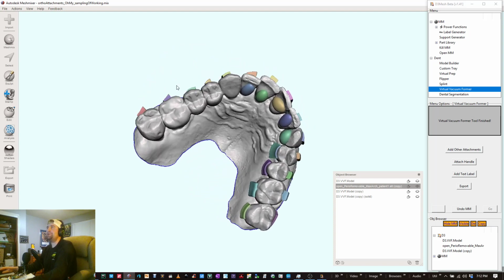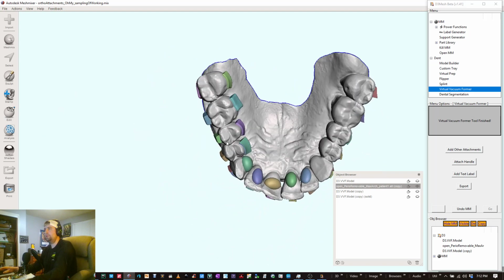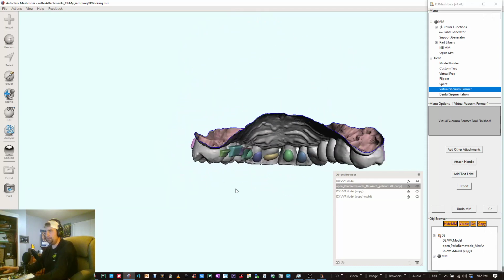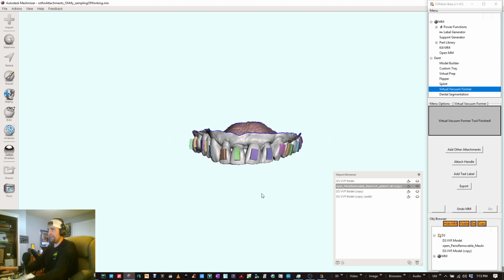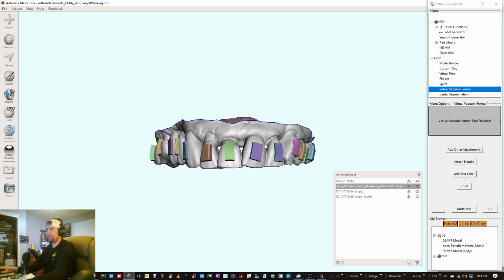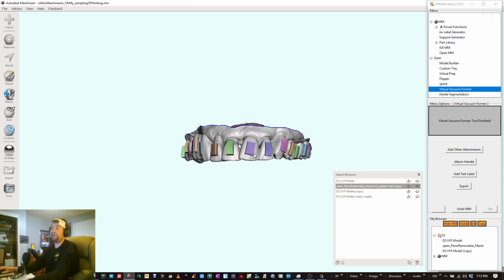You can kind of see all the different dimensions and how it works, and just how awesome they wrap around the tooth and intimately fit to the surface. Those are all the attachments currently. Soon to add quite a bit more, but for now, I just wanted something in there to show that this can be done, and that's basically it.